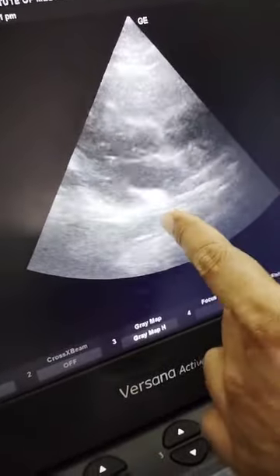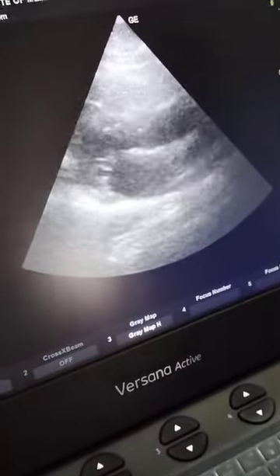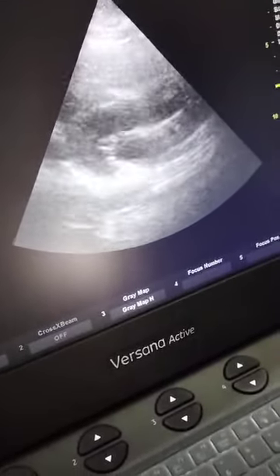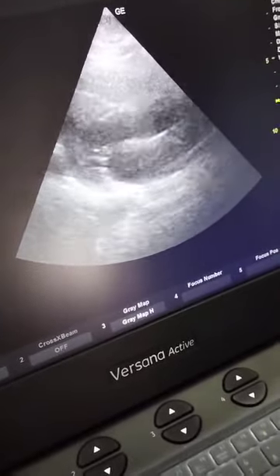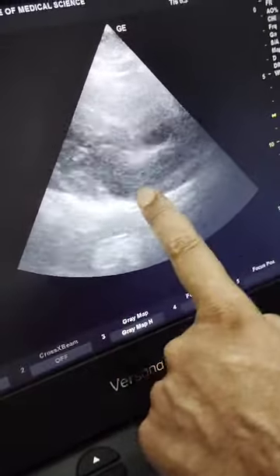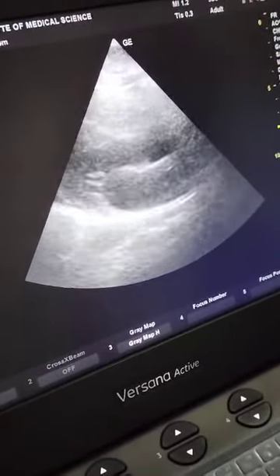This is very typical. This mitral annulus moves anteriorly like this. This is very typical of diastolic dysfunction, which is again because of the left ventricular hypertrophy, which has caused this increased left ventricular diastolic pressure and caused the LA dilatation. So this is all coming from eyeballing.